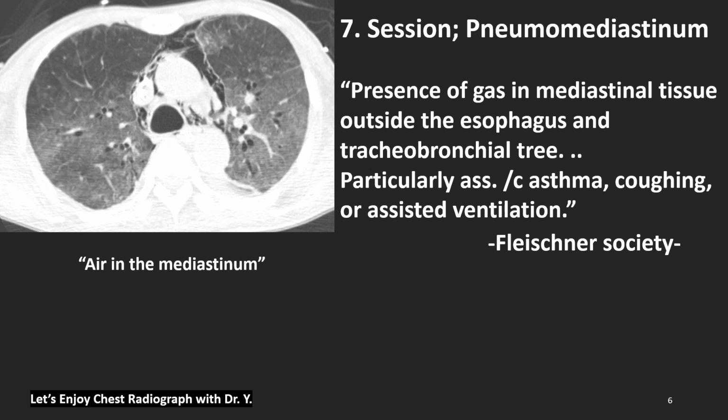You see this axial lung window setting CT scan showing the many gases in the mediastinal structure between the esophagus and pulmonary artery and between the aorta, and both lungs show diffuse ground glass opacity of ARDS.